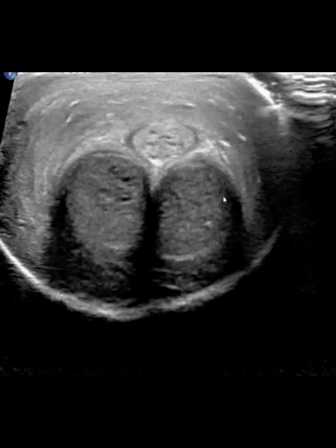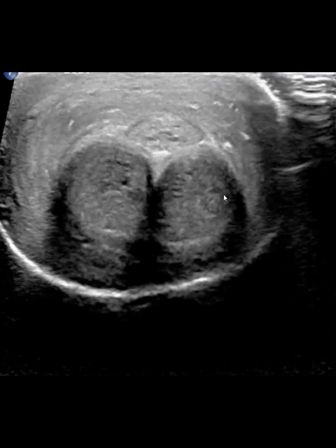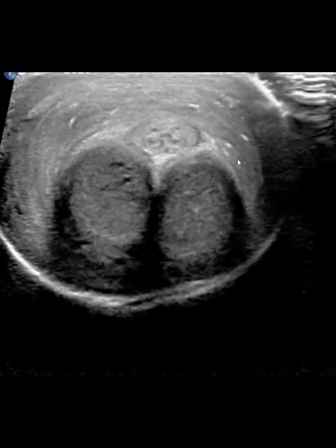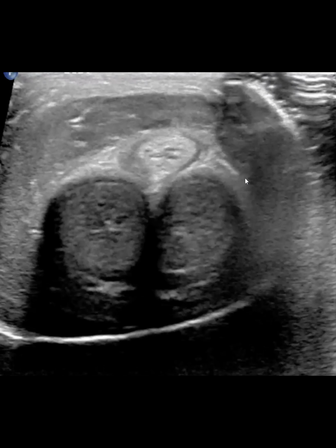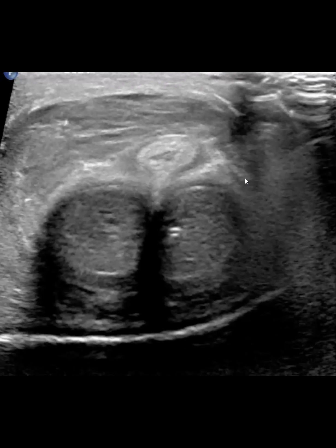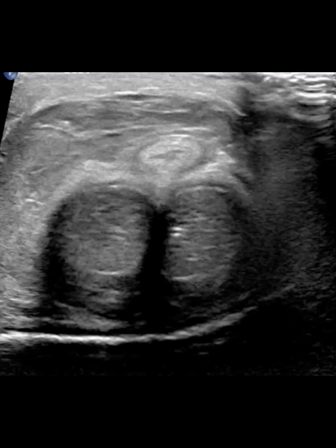Number one, so two questions here. The first question would be, what part of the body are we scanning? And the second question would be, any hints as to what the diagnosis may be? And then we can continue with the discussion.